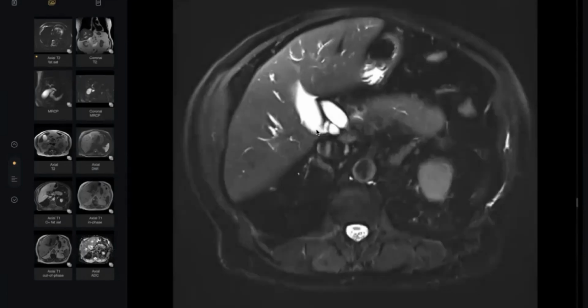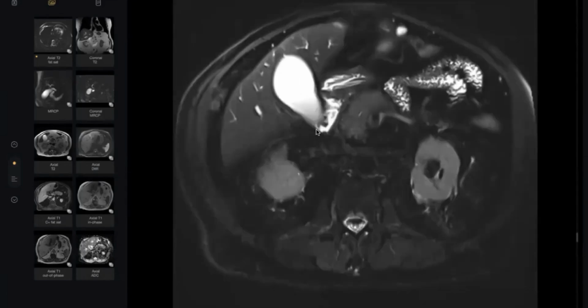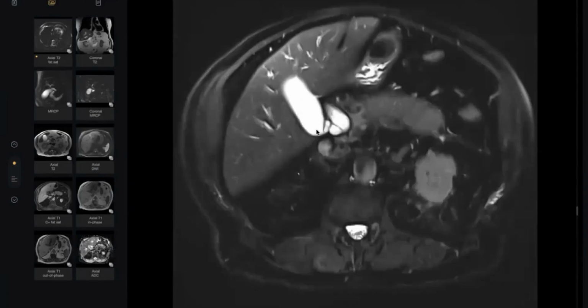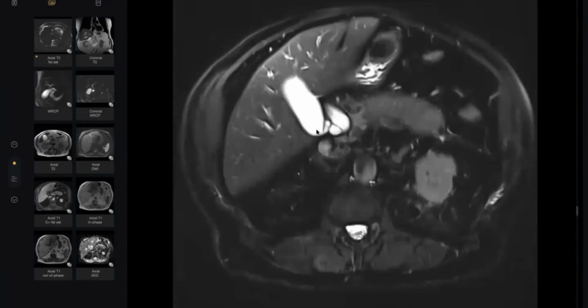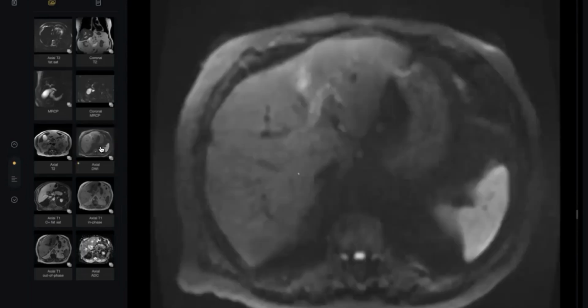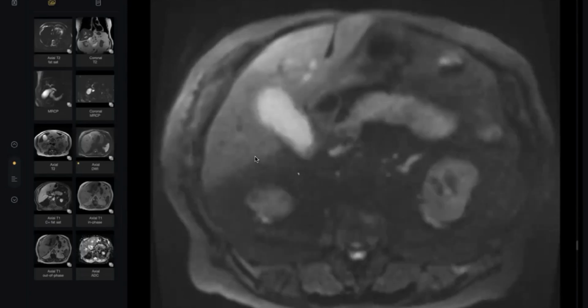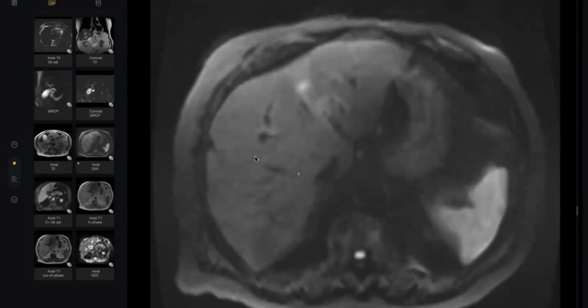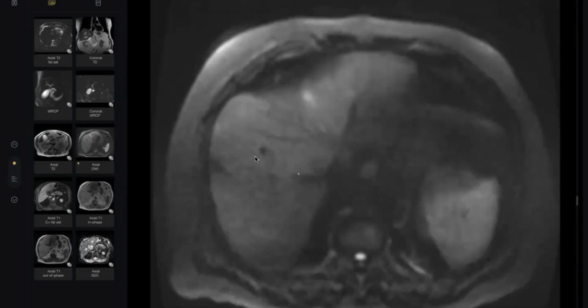Okay. What are you worried about? Sir, markedly dilated biliary system and swollen diffuse enlargement of the pancreas. Sir, can you show me DWI? It will add nothing. Sir, it's not the typical age for autoimmune pancreatitis. I'm thinking of some malignancy. No, it's bright on DWI. Could it be lymphomatous deposition in the pancreas?